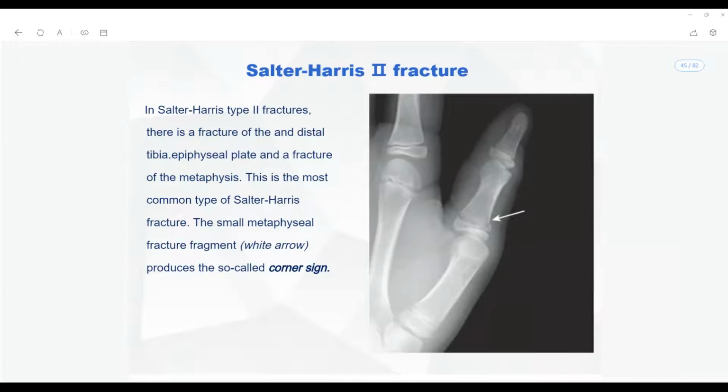See, when a growing tubular bone is actually coming together, finally all the bones should be forming a single structure. Yes or no? Yes, Benedict, is this point clear? Finally, when the ossifications are complete, what actually happens? All the long bones should be forming as a single segment.